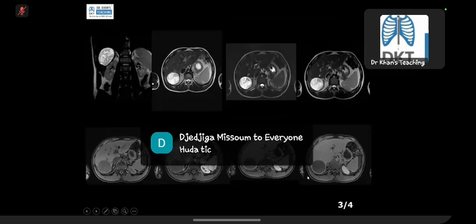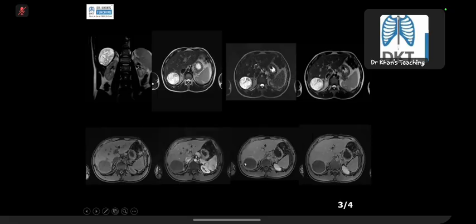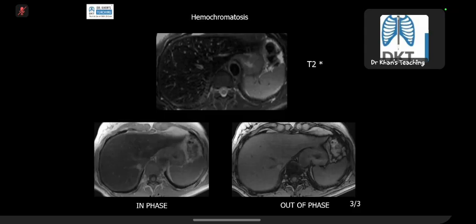And then we have got an MR. On MR, it is not enhancing. What is inside? Septi. So we call them membranes. There are membranes there. And these membranes should be in your mind, because sometimes there are daughter cysts, sometimes these membranes inside. And the key point is it will not enhance. So that is what we call a hydatid cyst.